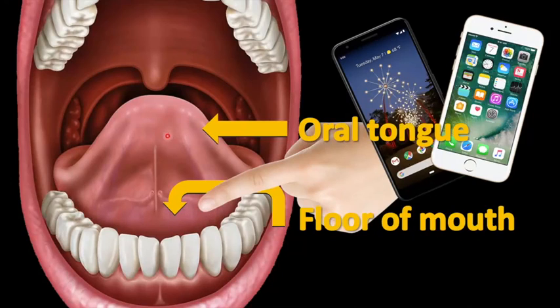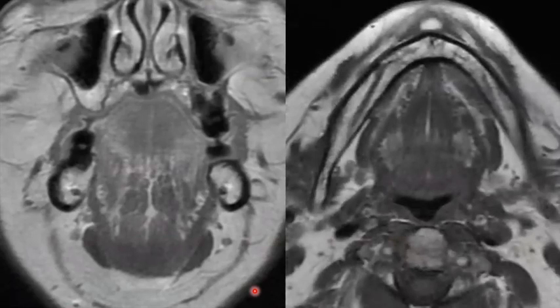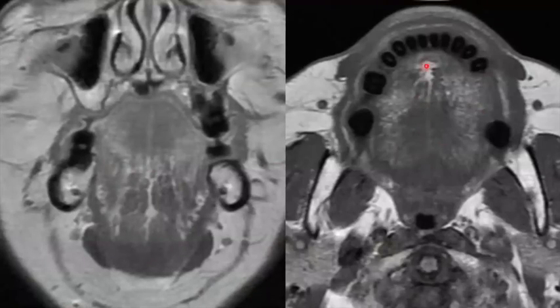Now, of course, when you image people, the tongue is folded down. So again, the mucosal surfaces appear opposed to each other. But we really need to feel really confident that we understand some of these anatomical landmarks. So let's go through these critical landmarks. So let's come back to here. We're in the body of the tongue. So these are the intrinsic muscles of the tongue here in the bulk of the body of the tongue.